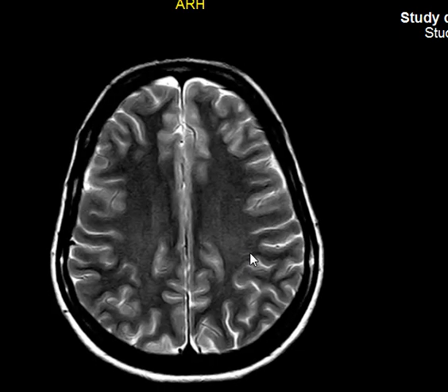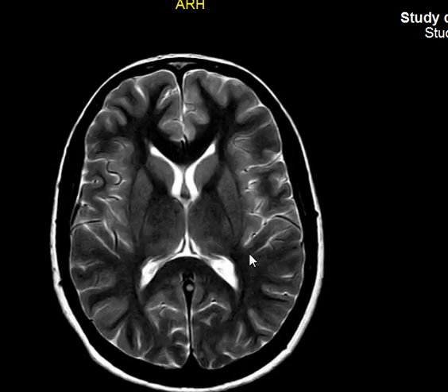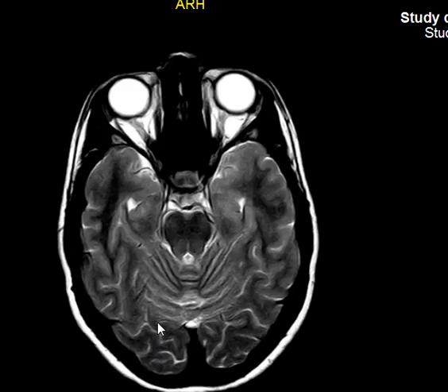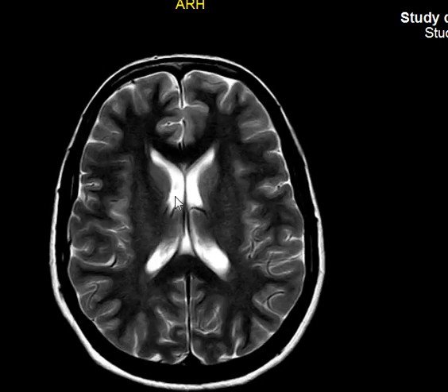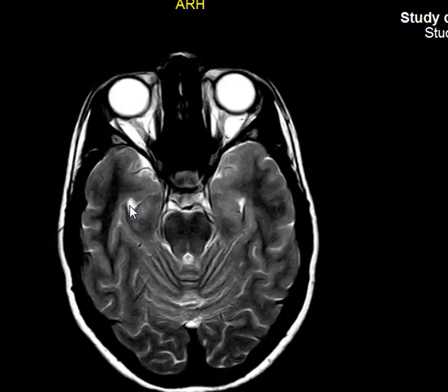The ventricles of the cerebrum: we have the lateral ventricle, which is the biggest one. What do we have in the lateral ventricle? We have three horns. The frontal horn of the lateral ventricle here. We have the occipital horn of the lateral ventricle. You can see it here going to the occipital lobe. And we have the temporal horns of the lateral ventricle.